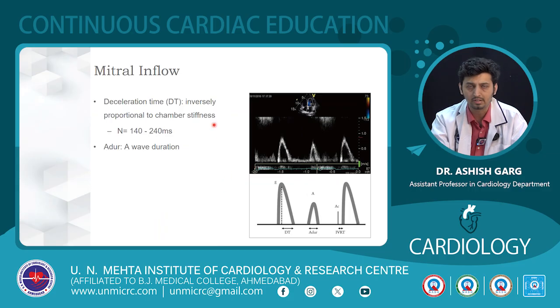The deceleration time is inversely proportional to chamber stiffness. So the more the chamber stiffness, the less will be the deceleration time. And another parameter is the A wave duration. So deceleration time is measured from the peak of the E wave to the baseline.